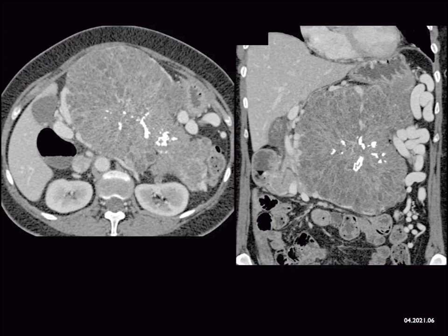So what can I say quickly? It's not a lymphoepithelial cyst. Those are water density, homogeneous, and smaller. SPEN tumors can have calcification, but usually it's a younger female, and the calcifications are peripheral. And the cystic appearance of this lesion, I don't like it. Mucinous cystic neoplasms are typically cystic lesions, body of pancreas. If they calcify, it's at the rim, but they're usually under 5 centimeters and body of the pancreas. I guess this is the body, but again, that cystic appearance and the Swiss cheese appearance, that's really serous cystadenomas.